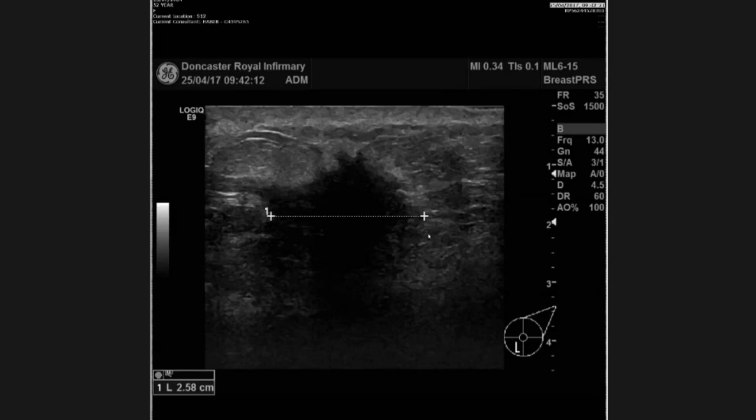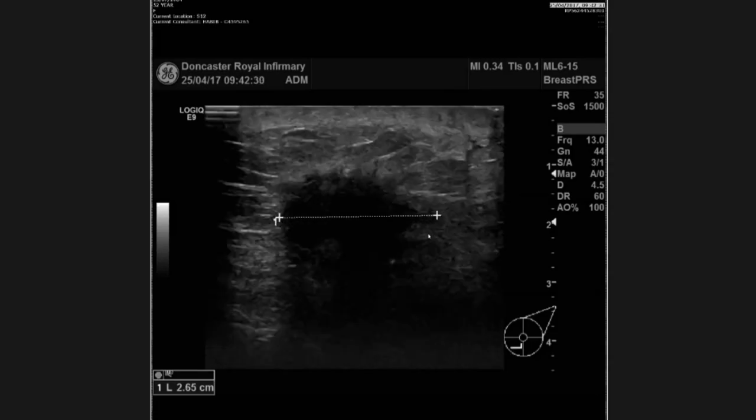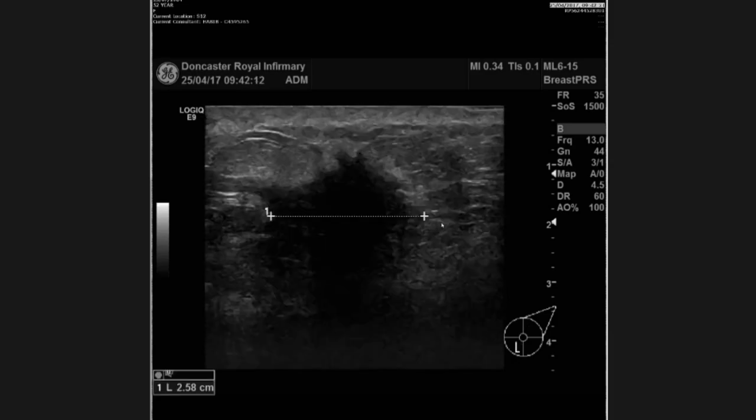Okay, I'm provided with the grayscale ultrasound of the same patient, and in this image, I'm able to appreciate an anti-parallel ill-defined hypoechoic lesion having posterior acoustic shadowing, which appears to be inseparable from underlying muscles, having spiculated margins. I'm unable to appreciate any calcification, so to me it appears to be a suspicious lesion, again category U4, and I would refer the patient for biopsy and multidisciplinary management.